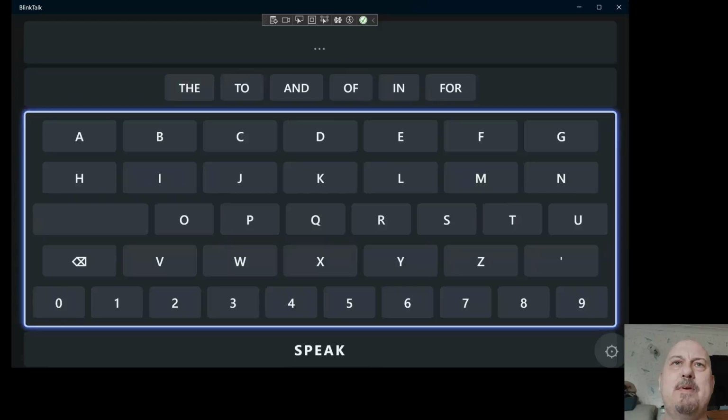You can speed it up if the person becomes more proficient and they prefer it faster, but I think this is usable. So whenever you indicate, it will go into the area that it's currently highlighting. So in this case, say I want to say hello to somebody. I've never used this app before. This is a clean installation. It's got no history of the kind of things that I like to say. So it doesn't know that I'm going to say hello.